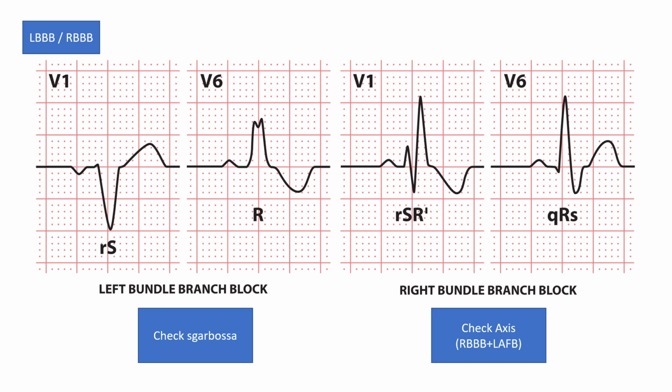In the OMI lecture I did, there's an example of it. And if this goes down, then this one must come up, right? As we saw in the electrophysiological way. So this is like a mirror pattern, this M kind of configuration. So this is a classical left bundle branch block.